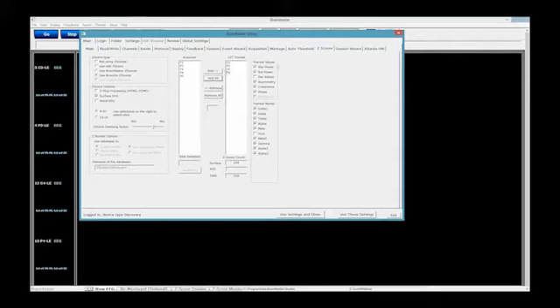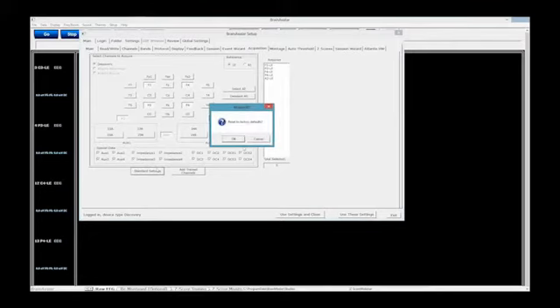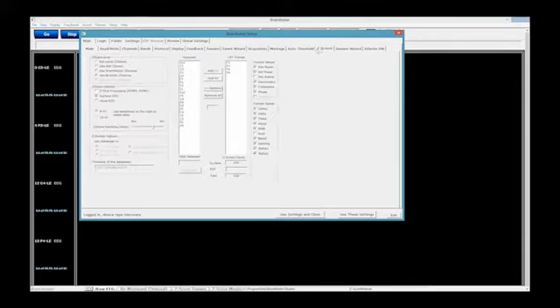To go even further, if we wanted to do 19 channel Z-score training, I have my discovery setting, and I hit my standard settings, which is going to reset to factory defaults, the standard 1020 connections right there. FPZ and OZ do not have Z-scores. For the record, everybody out there, if you call me up on technical support and say your OZ Z-scores are all 0, I'm going to say yes, they are. So standard settings is what you want to hit if you want to do 19 channel Z-score training. But once again, after we make a change on this tab, we have to go back to our Z-scores. So then we hit remove all and add all.